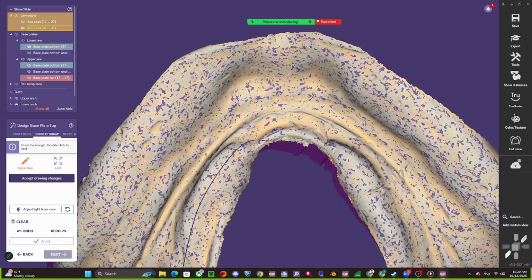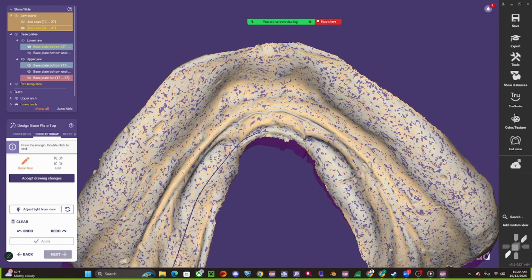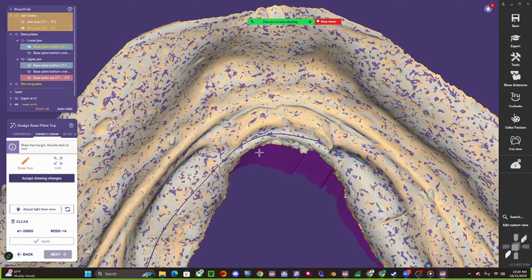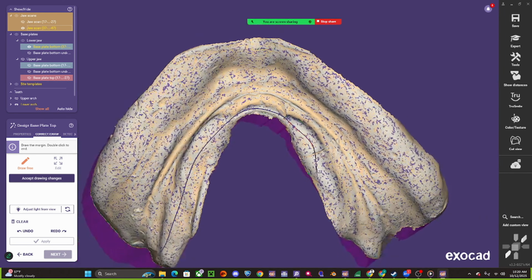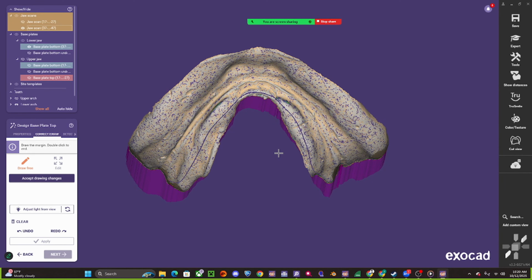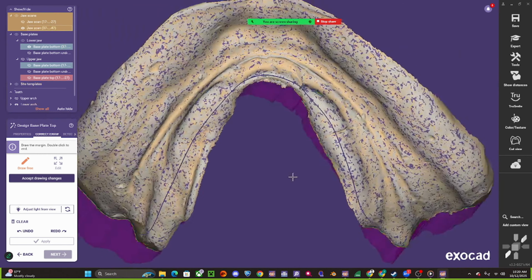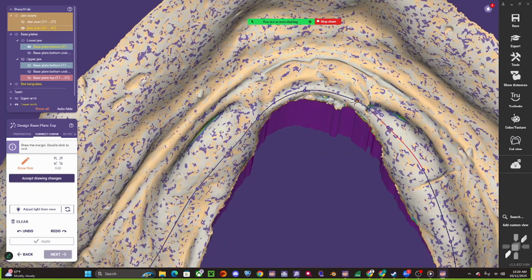this ridge. So I want to take this over here because lingually it was probably trouble to capture some sort of ridge on this 95-year-old patient. I imagine all this bone is gone if I were to look at the CT. He's got a really small ridge, so we need to get anything and everything we can on this lower. So I'm going to make sure to turn that jaw scan on so I can see the anatomy and have an easier time marking this.